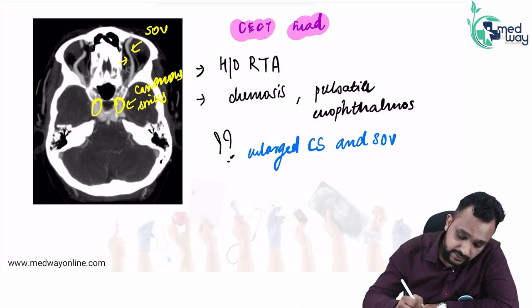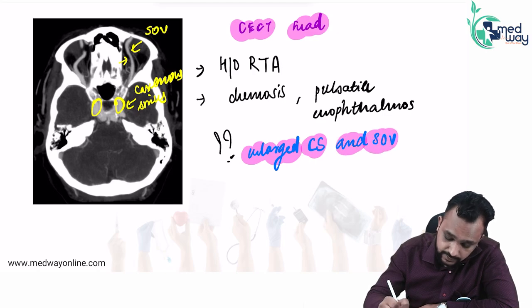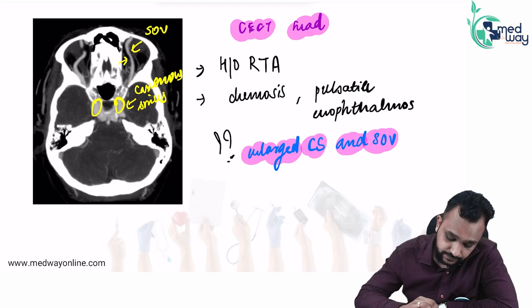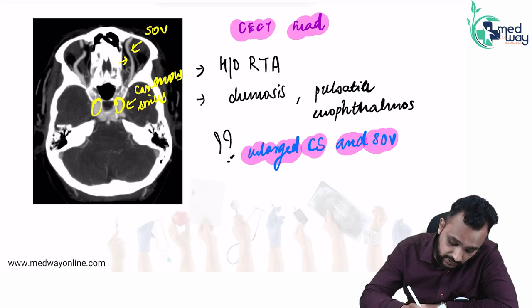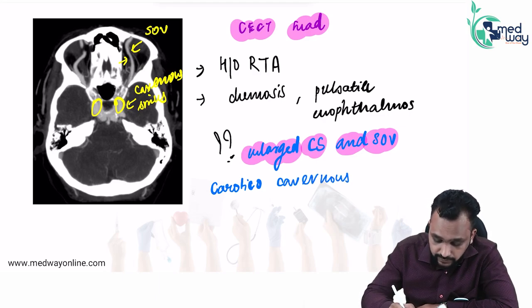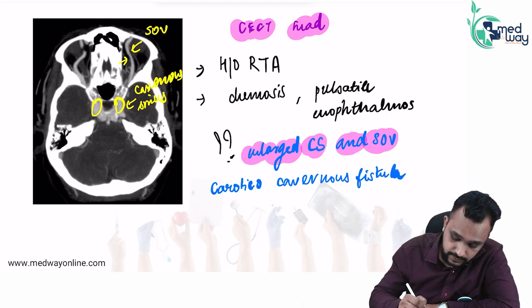This is occurring because of the formation of a fistula between internal carotid artery and cavernous sinus, known as carotid-cavernous fistula, right?